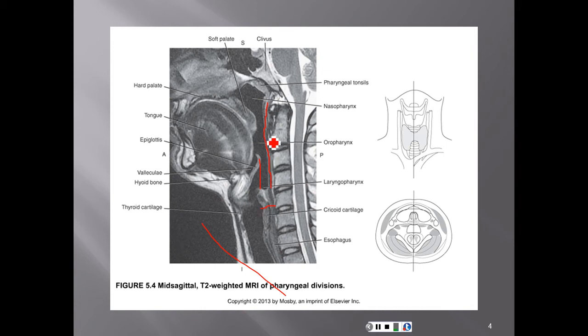If you have prevertebral soft tissue swelling before C5, so we got 2, 3, 4, 5, highly suspect fracture, and that soft tissue swelling is blood.